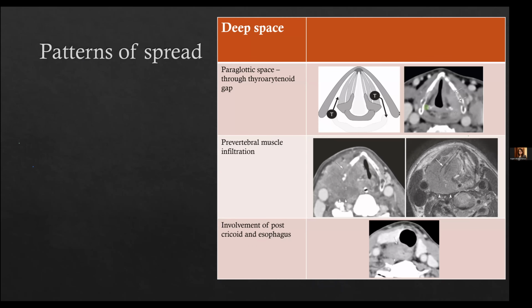So basically, the most common use of diffusion imaging is in tongue cancer. It definitely has a prognostic value in tongue cancers when we look at nodal involvement. Sub-centimeter nodal involvement is very commonly seen in head and neck cancers, and in those cases, when we're looking at the nodes, diffusion-weighted imaging is quite helpful. Also for identification of smaller lesions, obviously it depends upon the histology of the lesion. If it is showing diffusion restriction, then it can be easily identified. But the problem with diffusion-weighted imaging is that generally its resolution is not that great.